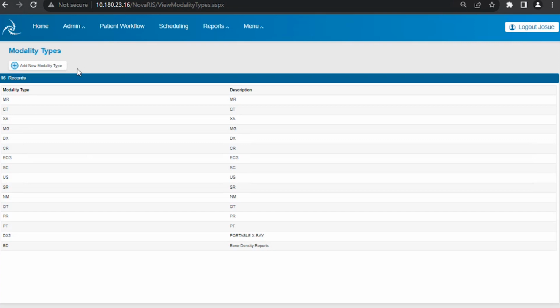If you are here and, for example, you are adding a new modality to your site, maybe you are expanding and you're going to get a new ultrasound and a new X-ray, you can do that manually here. Or you can also just go and hook it up into the PACS system, and then the PACS system will also look for that one and will enable that by default. That is something that you can call support. You can say, you know what, I want my PACS system to automatically create my new modalities, and they can help you select that option there.